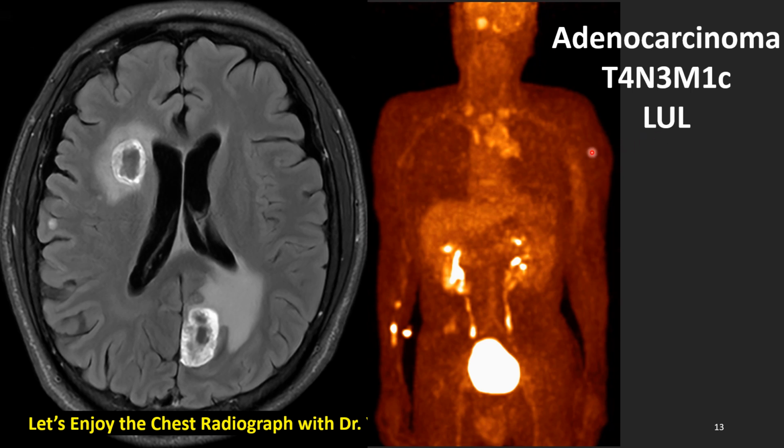This is the usual shape of lung cancer, an everyday shape. It is famous for brain tumor. What is the common tumor in the brain? Primary tumor or metastasis? Yes, metastasis. What is the number one metastatic tumor to the brain? It is lung cancer. So the number one brain tumor is metastasis from lung cancer.